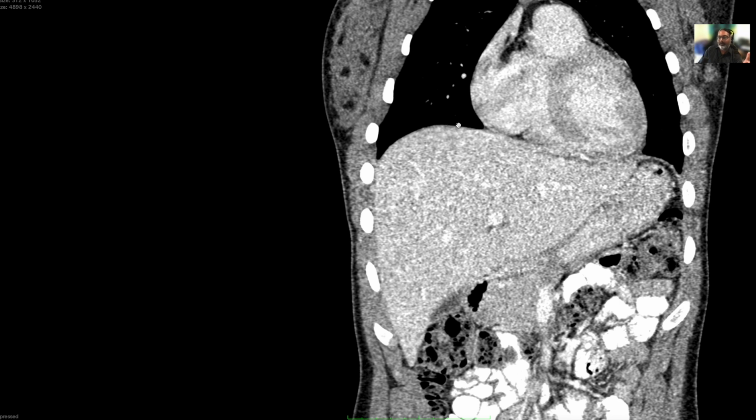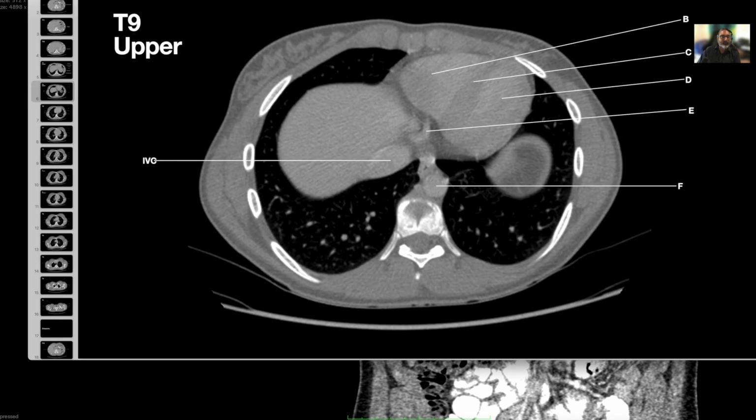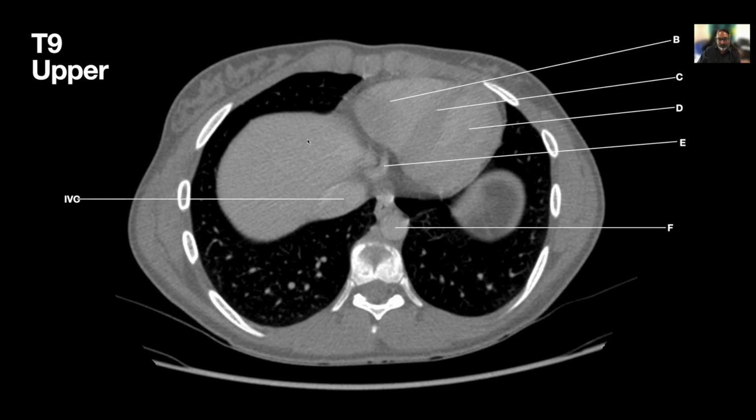So these are the layers here: the lung, both pleurae, the diaphragm, and then the liver. All those structures are here, but it's like one straight line, so it's hard to tell. But I guess you get the point. So you cannot tell too much of the difference between the liver, diaphragm and pleura at this point. Correct. That would then be the right ventricle. Yep, right ventricle.